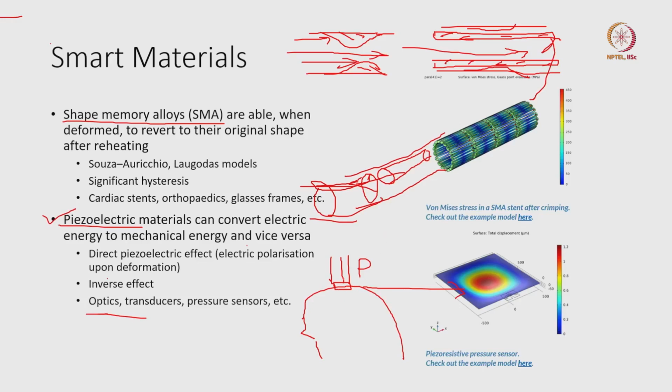So, the probe tip, if I just zoom in over here, a probe tip would be something like this. For example, it could be minimizing to a small point over here, which will be giving a focus, or it would be placed on the top of the tissue.